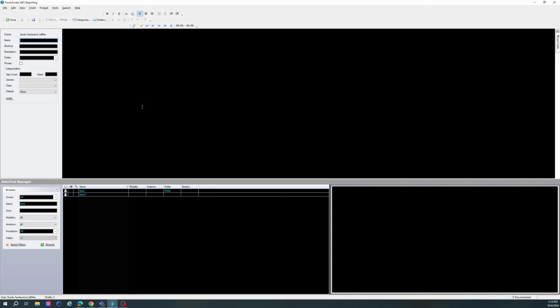So what I'm going to do is create a macro or a template for a chest x-ray, and that's going to be the basis essentially for building all of your other macros. And we're going to do it step by step. We're going to start with a simple macro, and then we're going to build up into more complicated but more efficient templates. So I'm going to free dictate what would be a normal chest x-ray radiology report. The way I like to dictate it, you can use the dictation style that suits you the best, but I'm just going to show you mine.